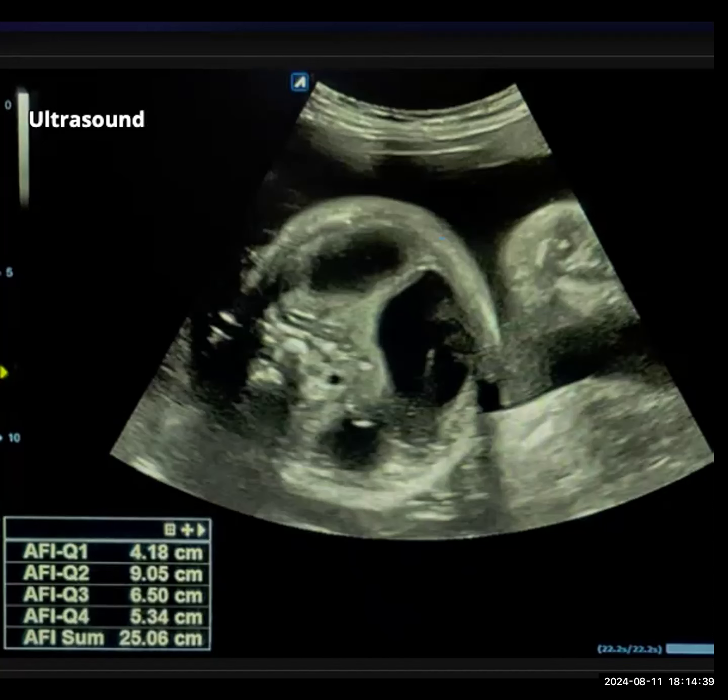What if I tell you this patient has a problem with passing stools, and in that case, he did a lower GI study and there was microcolon as well. Does that help? Okay. So the microcolon would explain the dilated bowel loops.